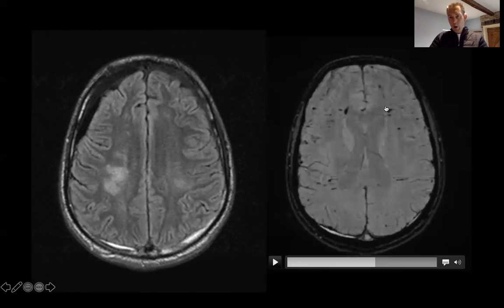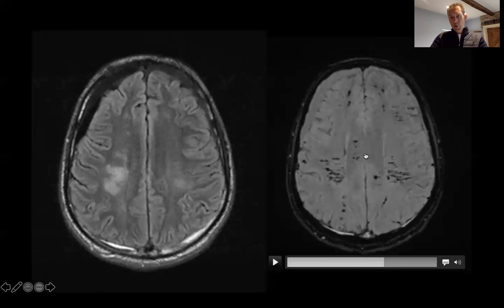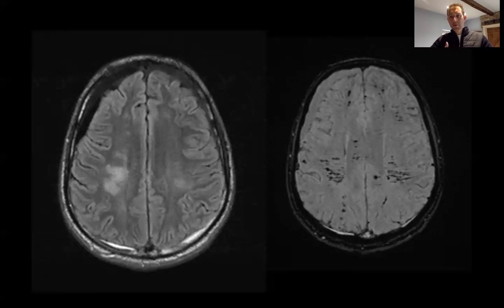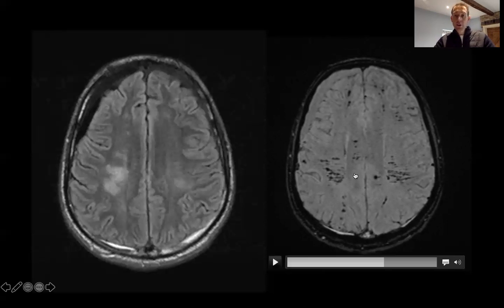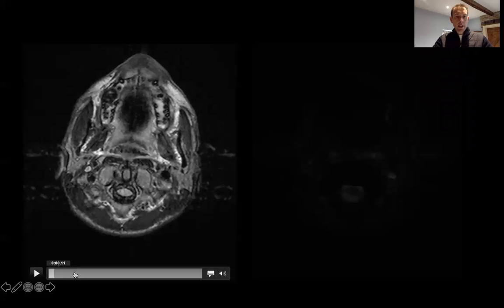You get deep white matter injury of the anterior fornix white matter, fixed white matter structures. There's corona radiata and some corpus callosum injury. So anywhere where you have a fixed, tightly packed bundle of white matter, with the axonal stress in acceleration-deceleration or rotational injuries, you're much more likely to get diffuse axonal injury in these areas. Likewise, the corpus callosum, but the cortex is relatively spared. In severe injuries, that I'll move on to show you next, you have brainstem involvement.